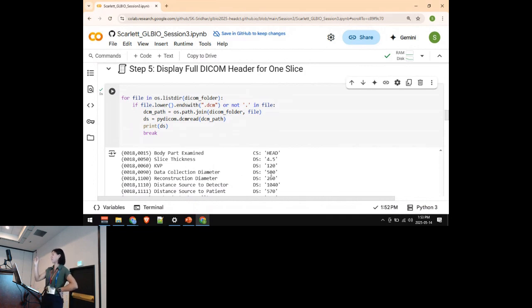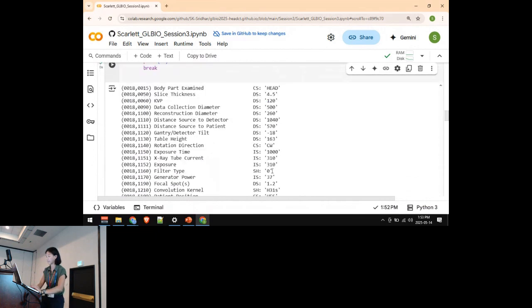Only the parameters of the CT scan are true. Anything related to where this CT scan was taken, about the patient, any location, has been de-identified. That's why some of these are not true. They have been modified.